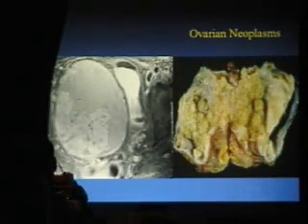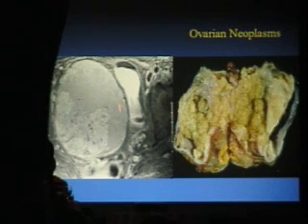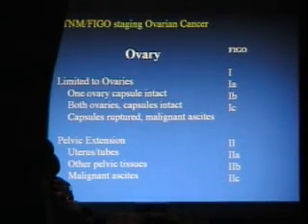In malignancy, primary adenocarcinoma of the ovary, here is MR, and then pathology. This is what I want you to think about when we're looking for those nodules on the inside of the cyst, the sort of vegetations, papillary growths that look like this, obviously, in pathology. And here in MR, a very large one enhances with gadolinium after the injection. Other than that, it looks like a relatively unilocular lesion with a fairly simple-looking wall. So this was clearly the malignant feature, and clearly not a benign lesion once you see that much enhancement.